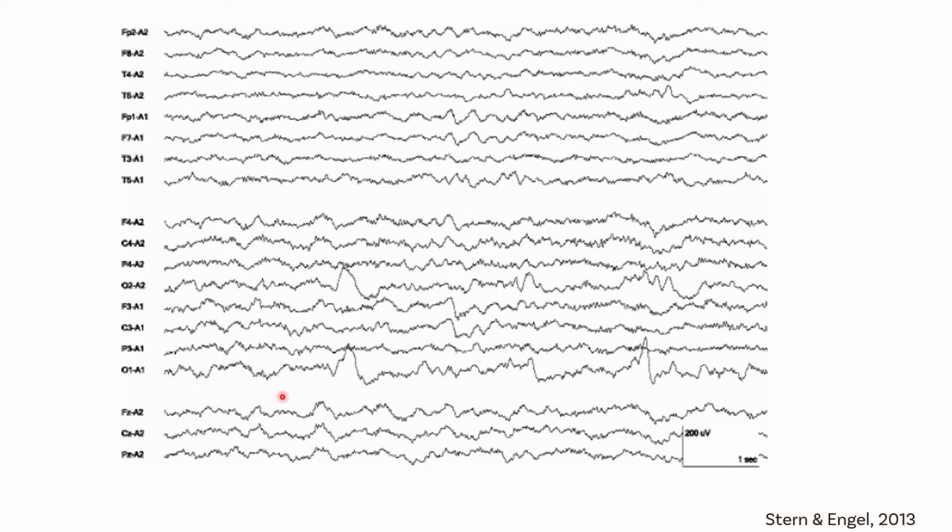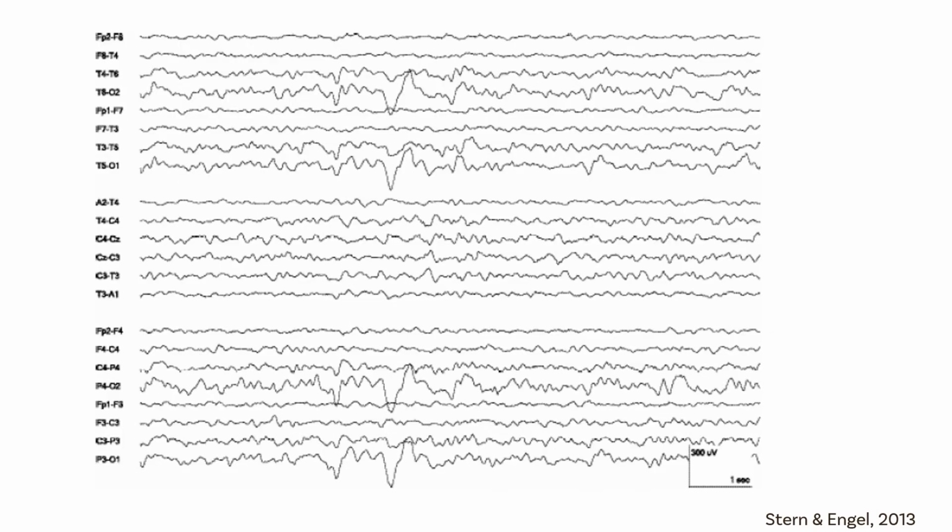So we have these triangular slow waves at O1 and O2 that last 400 milliseconds or so, 250 milliseconds. In this one, they're higher amplitude than the surrounding background activity, and they have that really triangular shape and a little bit longer duration than some of the surrounding waveforms. So that helps them stand out as cone waves. And our last example here, we've got a nice cone wave right there.